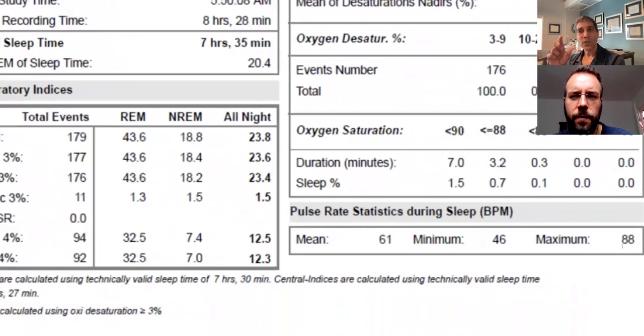But what does that tell you? There's also a problem with that. Heart rate variability is your heart's ability to change, to acclimate to each stress. So when you take a breath in, the heart rate should go faster. And then when you exhale, it should go slower. When you run, the heart rate should be able to go up. But this is actually a bad sign.